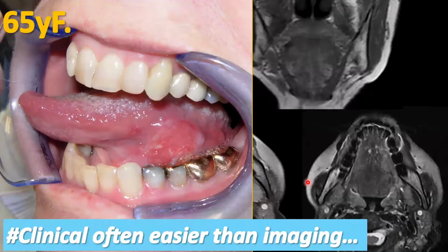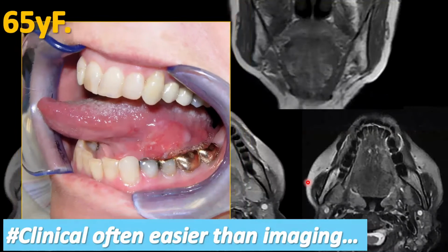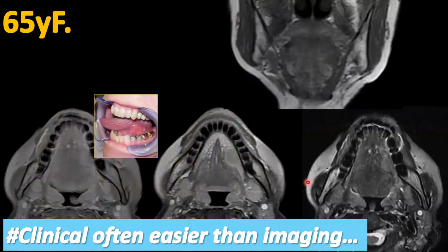And often these are much easier to understand with the clinical image than just looking at the CT or the MR. Most of these tumors arise from the lateral or the undersurface aspect of the tongue. And you can see in this diagram in this patient here, pretty nice to see on MR. And I do have to tell you that I think MR is a lot easier for a lot of these tumors because, as I said, with CT, they don't always enhance much.